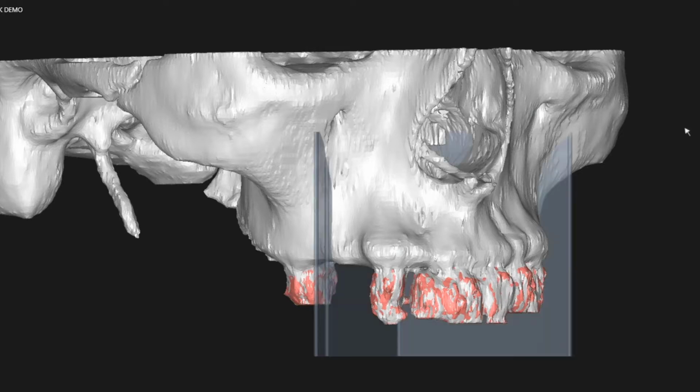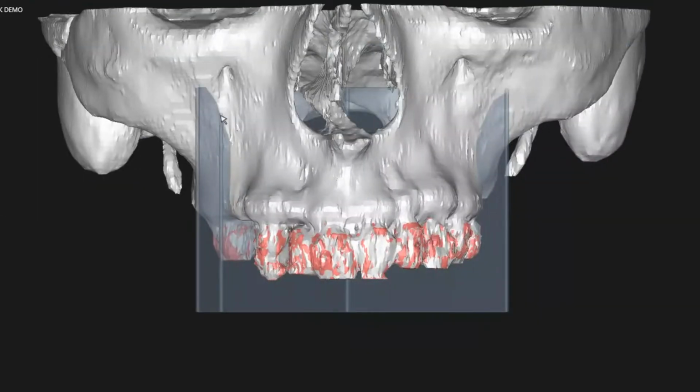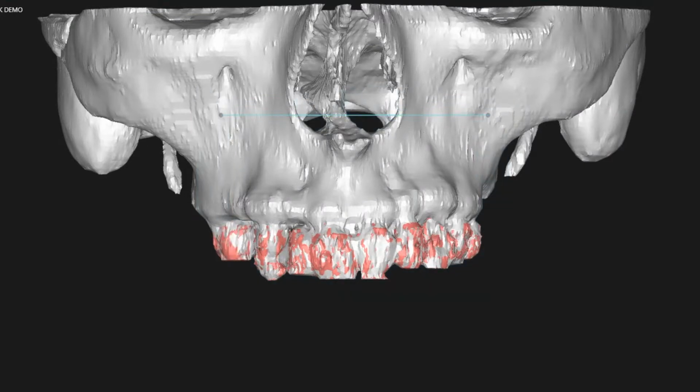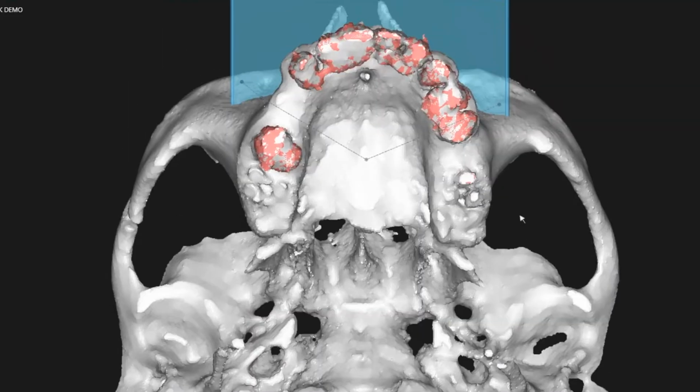Okay. So I have the other plane here. Correct, just coming straight across through here. Okay, got it. We'll just make it simple for demonstration purposes. And let me just lengthen this plane.